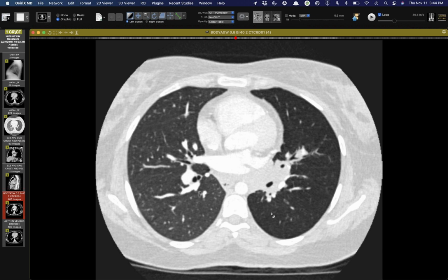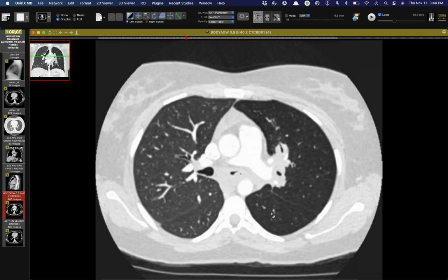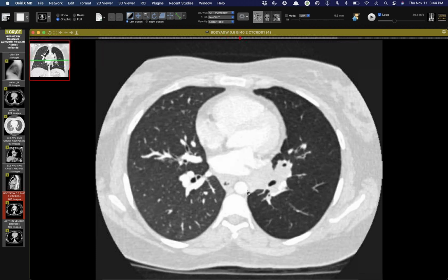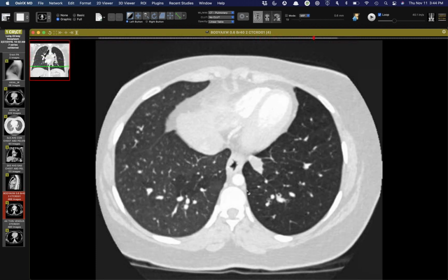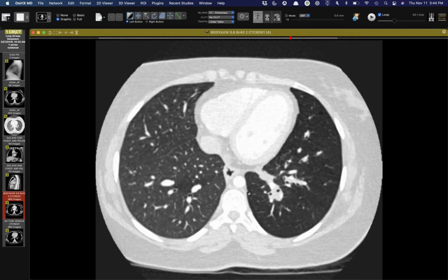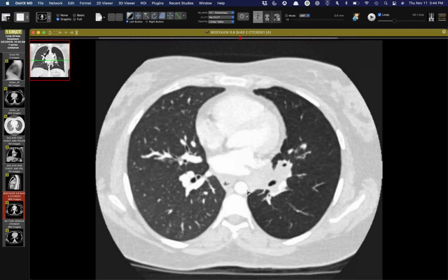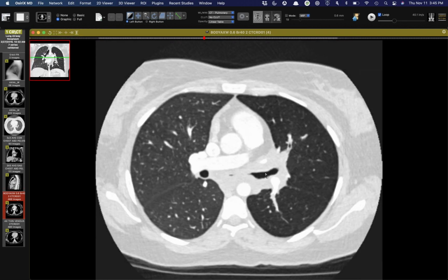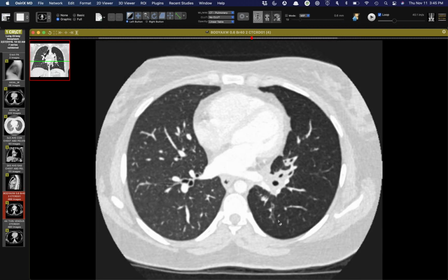I haven't either. I think we've all seen large retroperitoneal ones, or ones that just grow at the root of the mesentery along vessels. Certainly they're subcutaneous as well, but this is a plexiform neurofibroma. I was trying to make that into a vein there. Oh, wow. It's interesting because the vasculature looks fairly intact. I would agree with that. They're squeezed a little bit, but yeah. So it must be fairly soft, and that's why it's able to infiltrate like that.